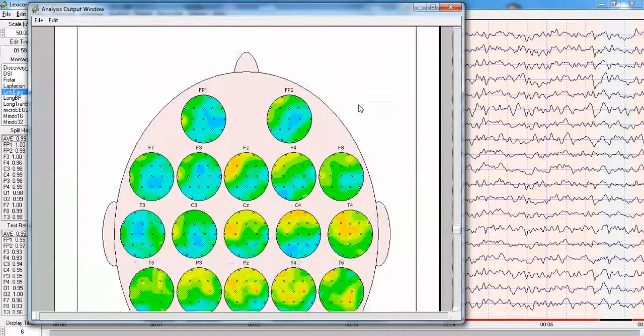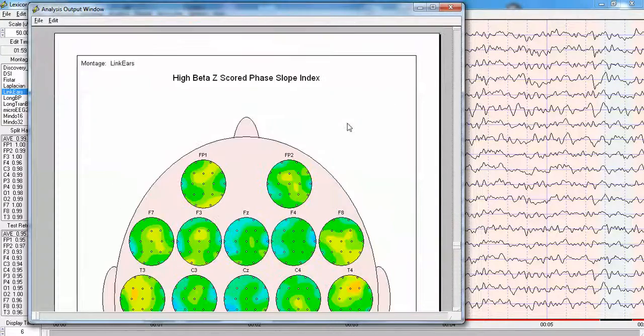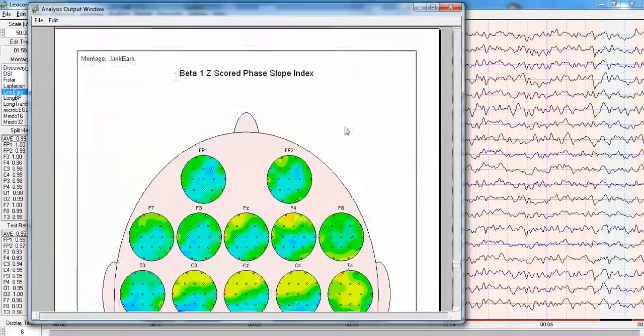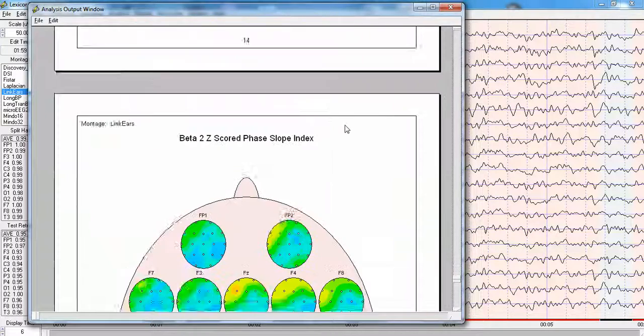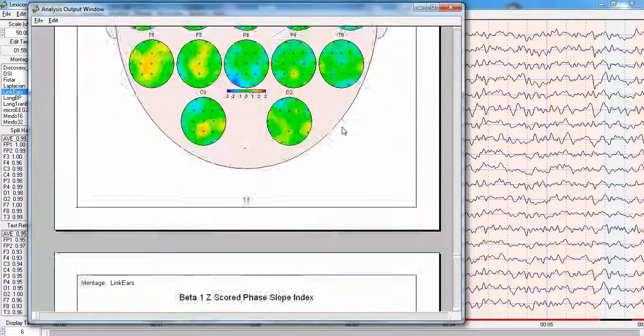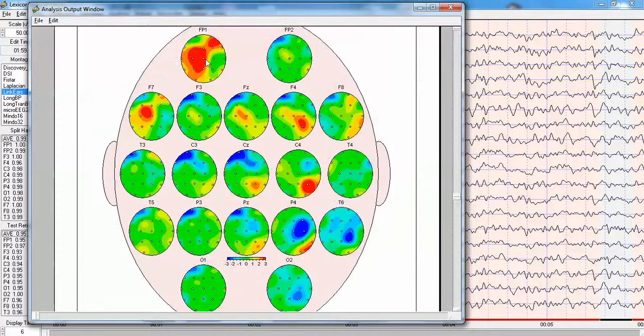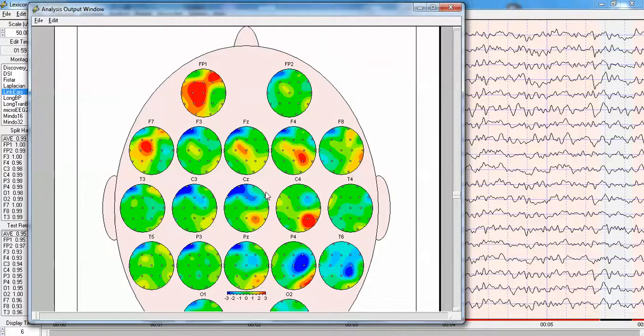And now as we go to higher frequencies, here's alpha, and it's fairly normal. The z-scores are within the normal range as we've seen. His problem is focal in excessive theta and delta, particularly excessive theta in the right parietal region. And also we know from the coherence that compensatory dynamics are going on here with the left hemisphere and the flow of information and the increased connectivity of the left hemisphere with respect to the damaged right parietal region.